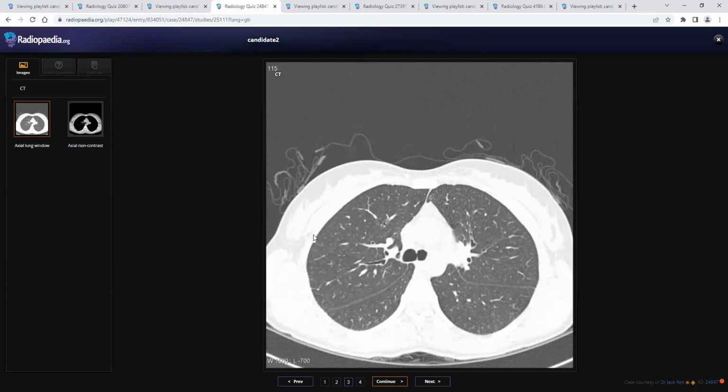Now, this is the only abnormality we saw on CT. So what do you think of this? It's a peripherally located nodule. It's a subpleural nodule. Subpleural nodules can, I need to review the rest of the imaging. Nodules with pneumothorax, I will think of LCH, maybe. So I need to review the rest of the images.